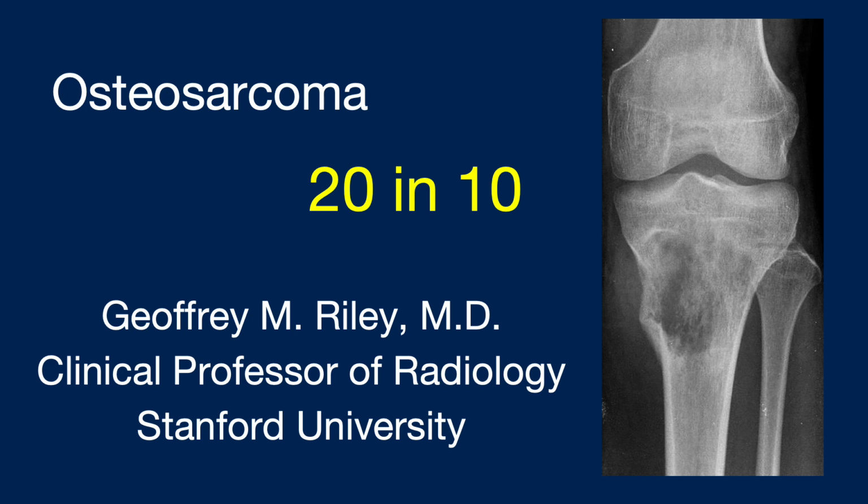Here are 20 osteosarcomas in about 10 minutes. I'm not going to go through all the facts of osteosarcomas, but rather the attempt is to imprint what it looks like radiographically, so when you see one, you think of osteosarcoma.